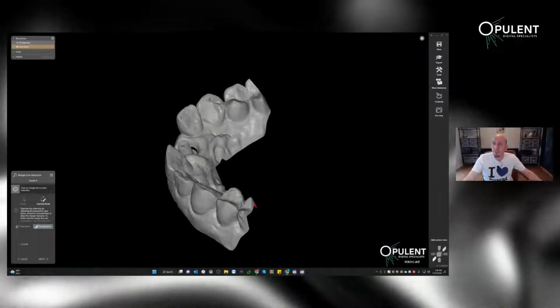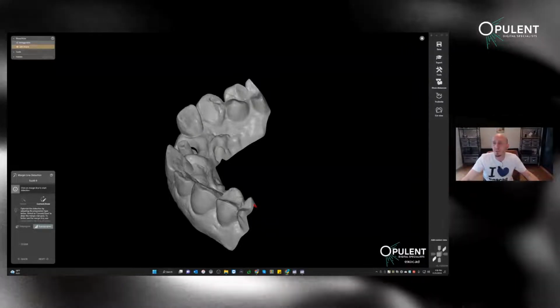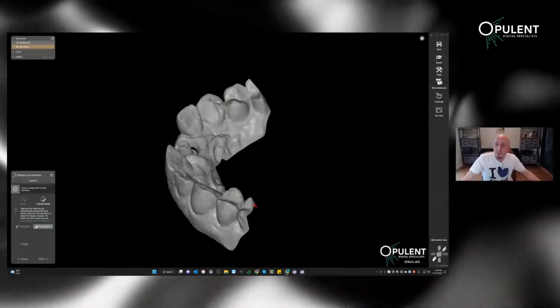Let me get rid of the caption here so you can hopefully see. I know the screen is a little smaller, etc. But you can hopefully still see what's going on. I guess I can also take myself off.